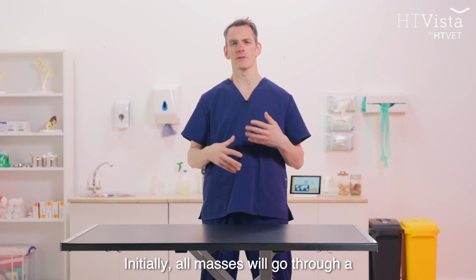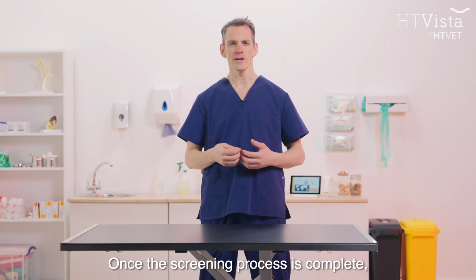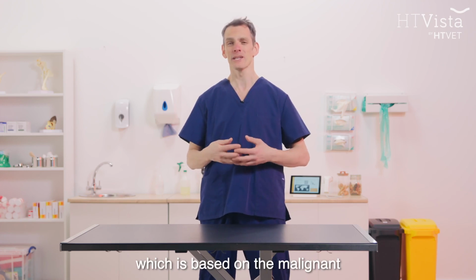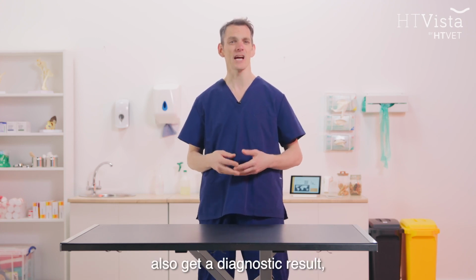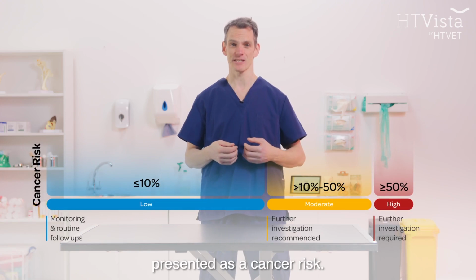Initially, all masses will go through a screening process with an algorithm based on a sensitivity of 90% and a negative predictive value of 98%. Once the screening process is complete, each mass will get a cancer risk value, which is based on the malignant probability of the mass. This will be displayed on your device as low, moderate, or high risk. In some cases, where the specificity is 90% or higher, you'll also get a diagnostic result, which can predict more specific types of tumours. The screening results are presented as a cancer risk.